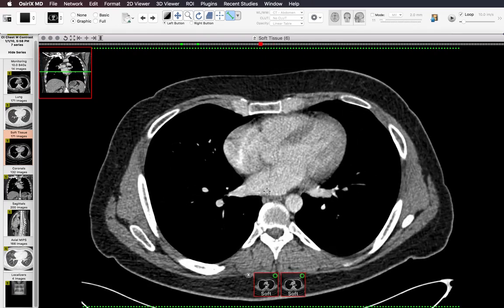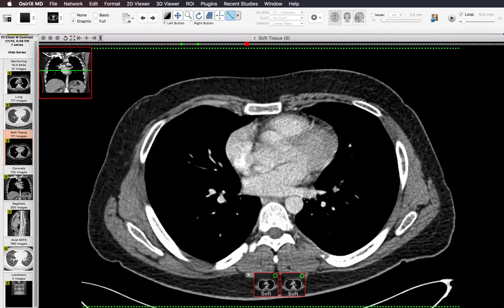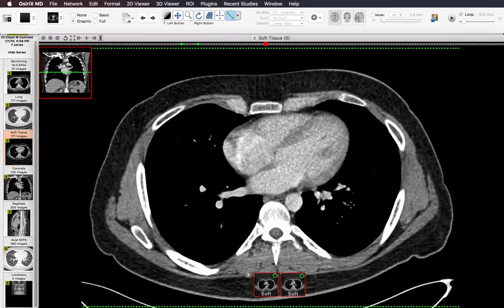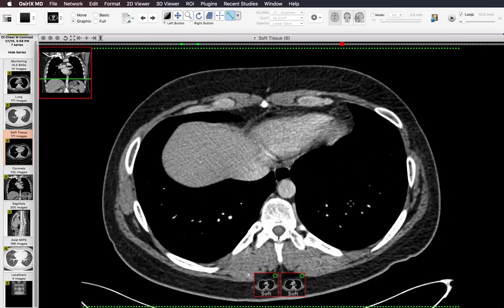While I'm looking at the left atrium, I'm also looking at the 4 pulmonary veins and making sure that they're not stenosed or occluded, which can occur after pulmonary vein isolation and other procedures. And then I'm done looking at the heart.